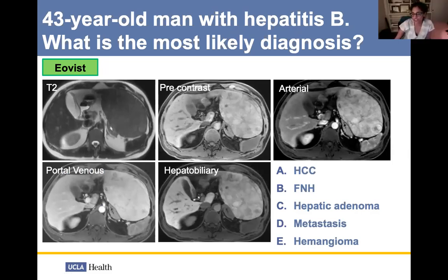It's coming off the edge of the liver. Oh gosh. You see, there's a space between that and the spleen. Actually, that's a classic blind spot: lesions that hang off the tip of the liver. Okay, got it. I remember that's exactly what the fellow said.